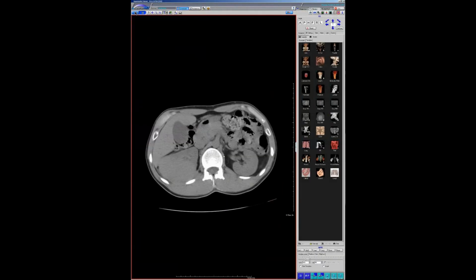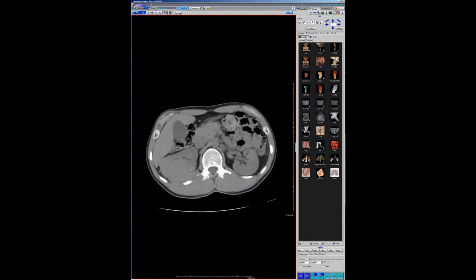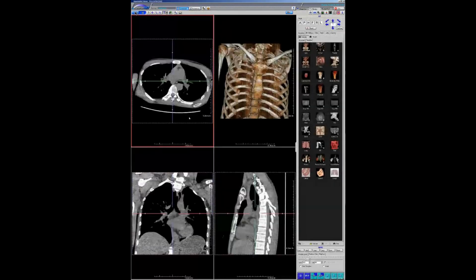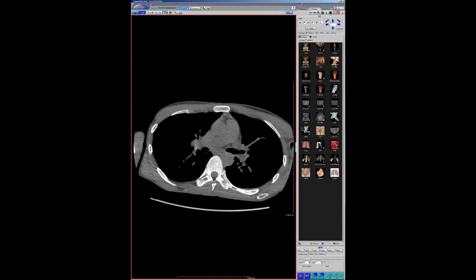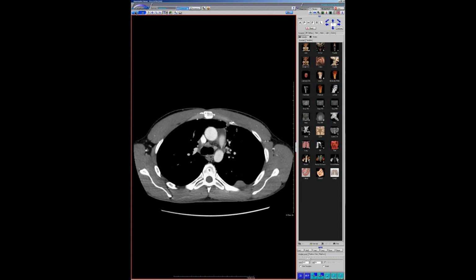This one's just quick. It's just a nice example. I think we've all seen it. It's just a pretty example of this. A young male who's got AMLs, and this is just a chest CT I just read this morning, where he has all the classic findings of TS. He's got the fatty foci in the heart.